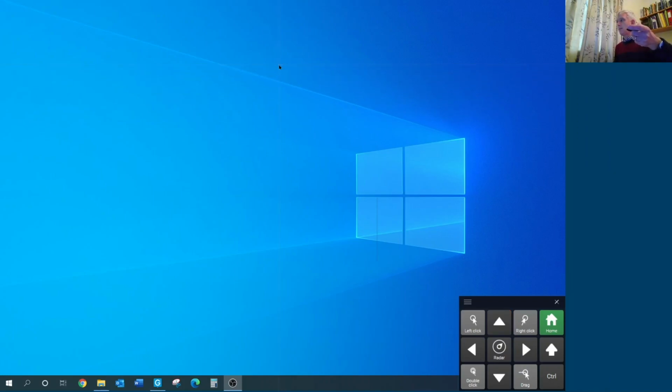until I press my switch again. I may want to push it left. First row, second row. And you can now see that it's traveling across the screen. And I'll press stop. So that way I can move my cursor to where I want it to be, and then I can choose left click to perform a left click or a double click or a right click in that position. And that's something where there is no other way of moving the mouse to a point on the screen. That allows anybody who's only using a switch to get anywhere on their computer.